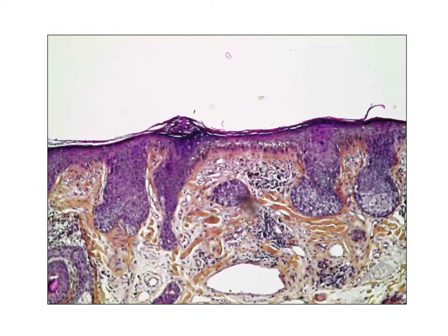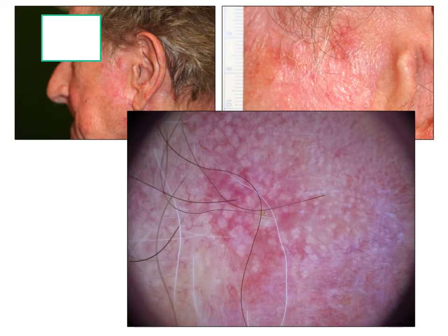But some of the plugs are in the follicular region, and this is typical of what we observe in actinic keratosis. This aspect has been named the strawberry pattern, and it is due to these follicular keratin plugs. What is important to consider is the irregularity in the size of the keratin plugs, and of course the reddish background of the lesion.